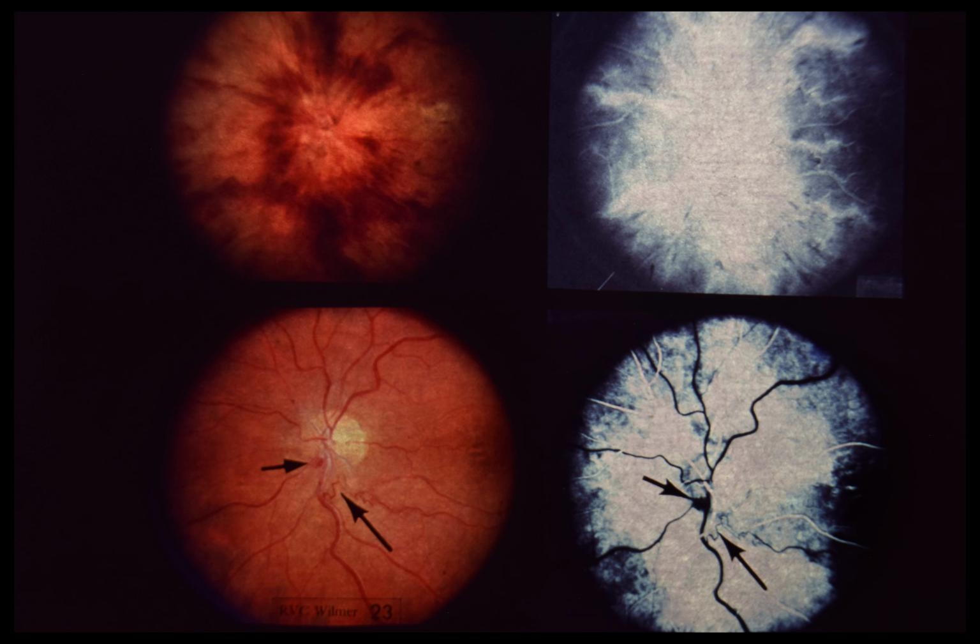There are 2 possible explanations for the favorable prognosis in papillophlebitis. First, younger patients with healthy vessels may be able to tolerate brief periods of central retinal vein obstruction. Second, the etiology of the central retinal vein obstruction may be different in younger patients. The typical features of papillophlebitis are an ophthalmoscopic picture of a central retinal vein occlusion with normal or near normal visual acuity in a young, healthy patient. Although this patient presently has no ocular symptoms, the abnormal fundus findings suggest that he may have had a true central retinal vein occlusion.